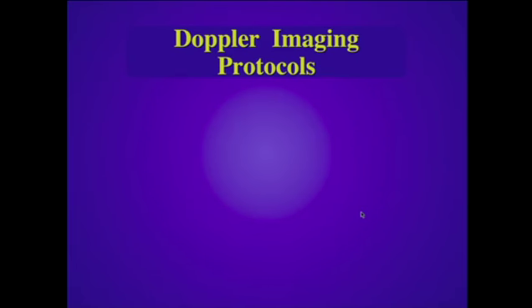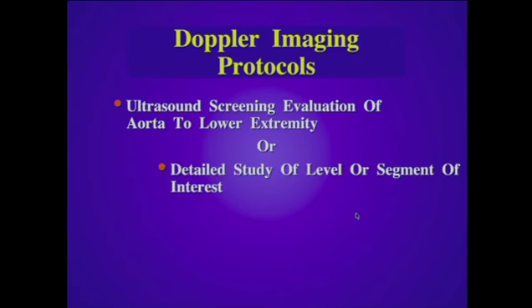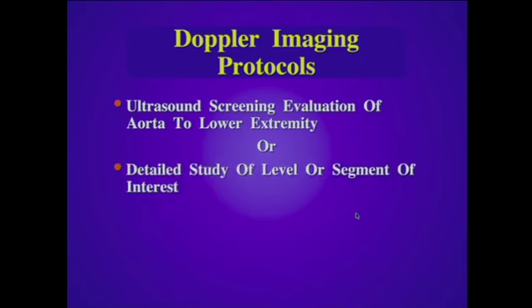There are different Doppler imaging protocols depending on the situation. One can perform ultrasound as a screening evaluation of the abdominal aorta to the lower extremity, or we can do a detailed study of the level or segment of interest that is identified from the indirect tests.